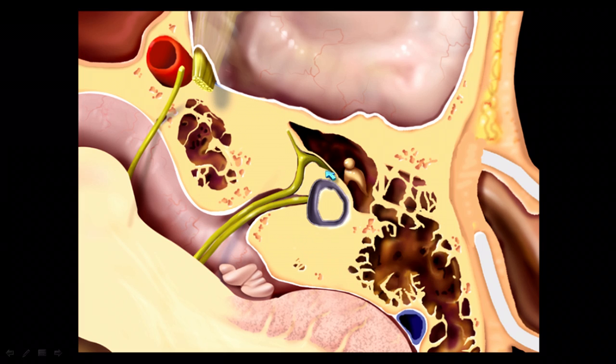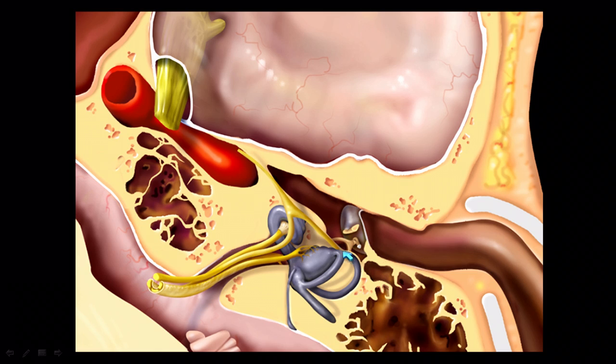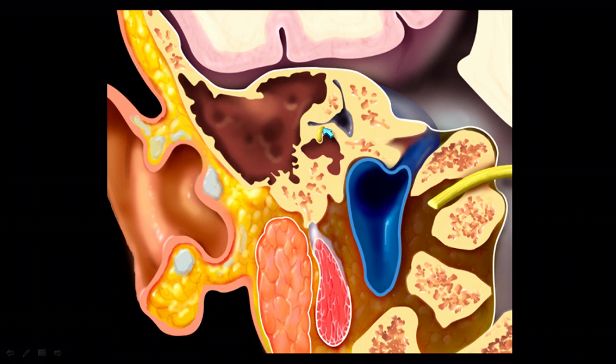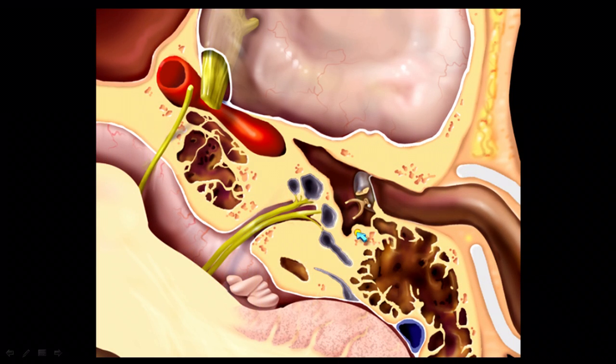Then we have a part going back through the temporal bone, so that's our tympanic segment, and it goes just under the lateral semicircular canal. So here's that tympanic segment going back posteriorly, and the greater superficial petrosal coming anteriorly, and that goes just lateral to the horizontal segment of the carotid here. In the coronal plane, here's our labyrinthine segment coming towards us, and the tympanic segment going back just under the beak of the duck, the lateral semicircular canal. And then we have our posterior genu, and then we have our descending or mastoid segment going down inferiorly.